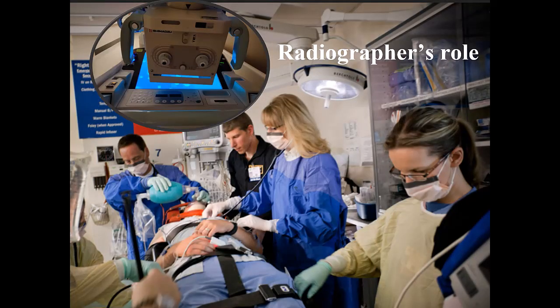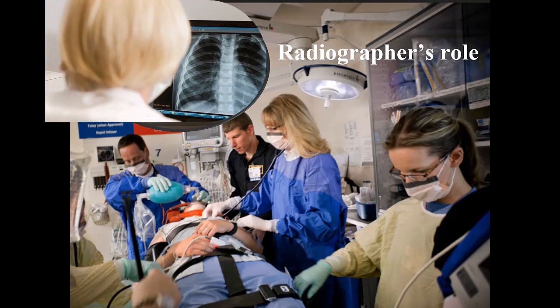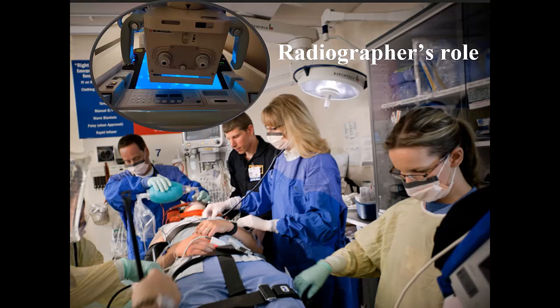What is the role of the radiographer? The radiographer performs as part of the ER healthcare team, and they must possess the skills to think critically and produce images that are diagnostic and timely. Remember, these are trauma images and not routine diagnostic x-rays. The radiographer must also practice ethical radiation protection, provide competent patient care, and perform quality diagnostic imaging as ordered.